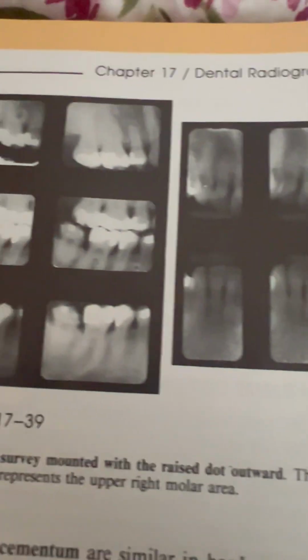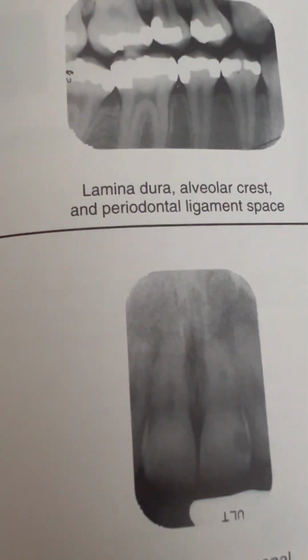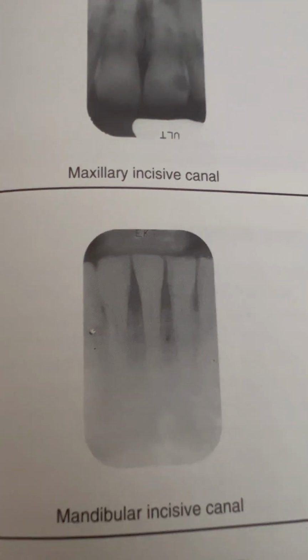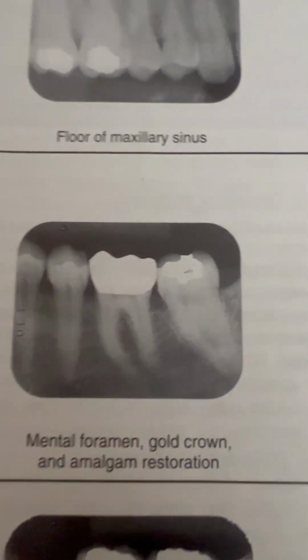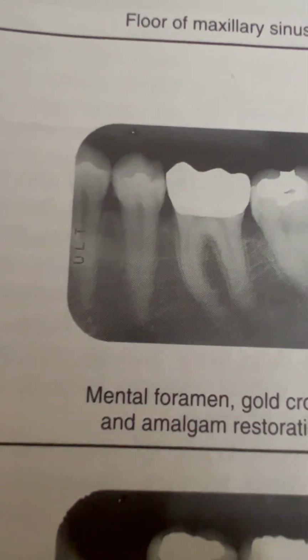So just to let you know more about full mouth x-rays, FMX series, or periapicals, PAs. You see individually a view of each tooth. Okay, see the cobwebs that I was telling you about, how you can tell when they're the lowest. See those little lines?